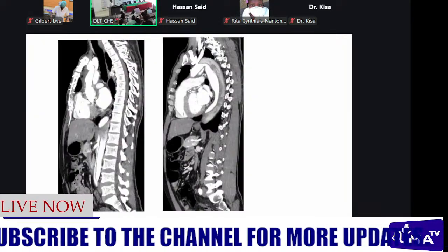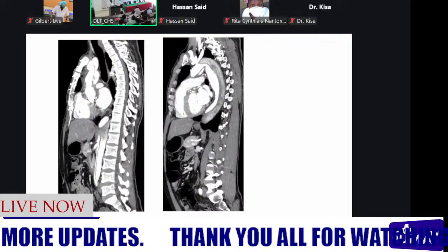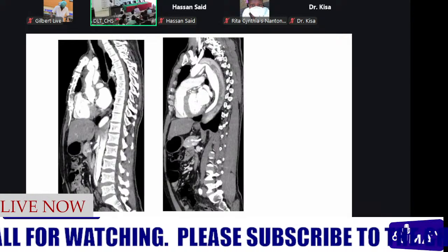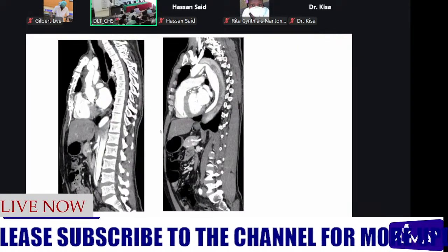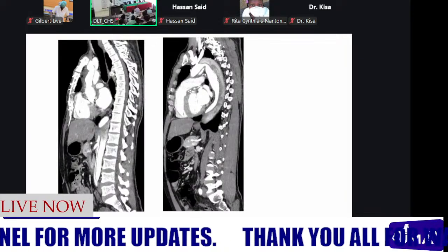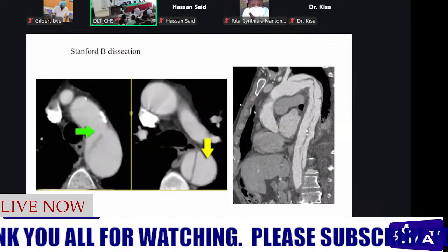So here, still these sagittal views. I'm just trying to demonstrate for this patient. We see the intimal flap, which is causing the dissection at this level of the ascending aorta. And when you look down, the dissection actually continued, and we have a very small true lumen, which is supplying the abdominal organs. Then at the level of the descending aorta here, we are still able to appreciate the true lumen, which is well opacified, then our minimally enhanced false lumen. That was for Stanford A.